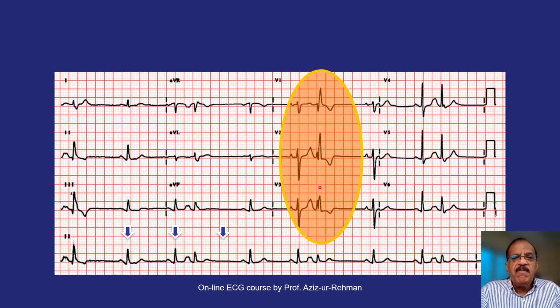I think any beginner, any person who does not understand this ECG fully would probably think that these are VPCs, because VPCs are generally broader and generally of different morphology than APCs. But this could actually be what is called an APC with aberrant conduction.